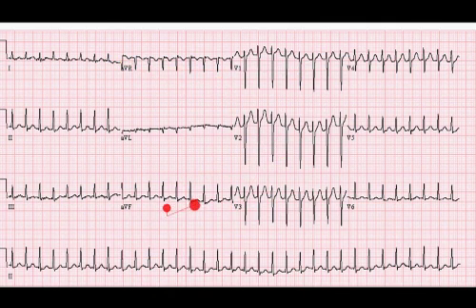So now we have a tachycardia. It's going at 200, and it's a narrow QRS tachycardia. And the first thing we have to look for is evidence of retrograde conduction, because the commonest tachycardia has a retrograde P. I don't see evidence of that in V1 or really in lead 2 and 3. And it is too fast to be sinus.